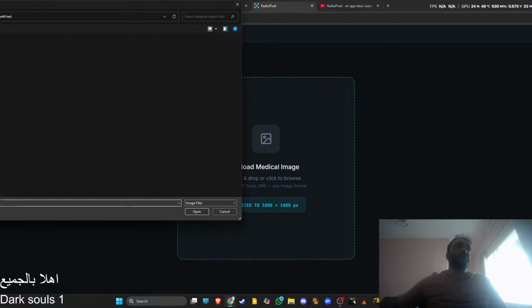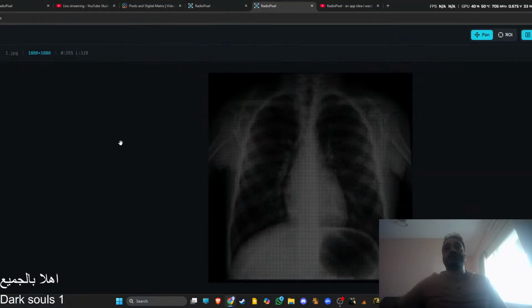You will upload an image. We have a chest X-ray here, and I don't know if I'm using an ultra wide screen, so maybe the side panel here is not visible in the video, but whatever. I'm not sure if I'm even recording this. Everything is scuffed here.